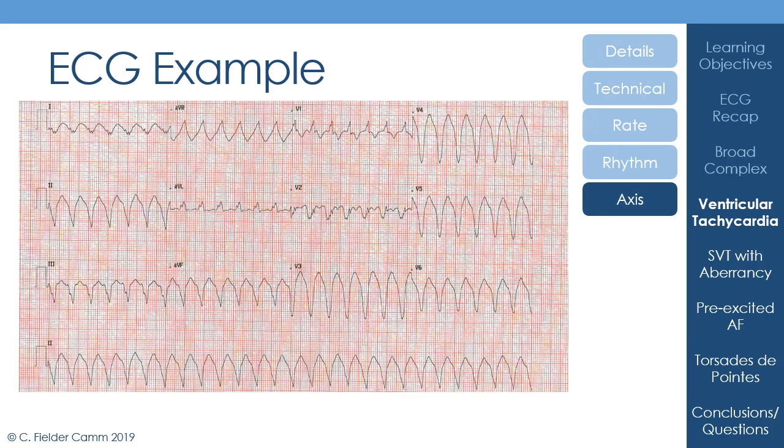Okay. Now, in terms of whether it's sinus rhythm or not, it's a little bit difficult to tell, isn't it? Because I can't see any clear P waves, which I guess points us against that.